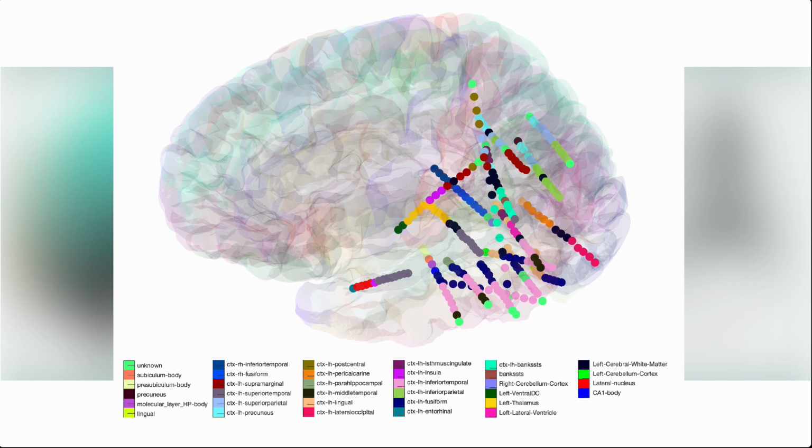A MATLAB data structure packaging the segmented brain model, electrode locations, and labels for many atlases used in the processing pipeline can also be produced for further analysis. In this video, we will talk through the steps needed to install VERA on Mac OS and Windows, as well as the necessary dependencies for following our standard electrode localization pipeline.